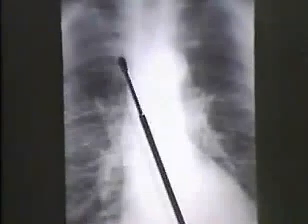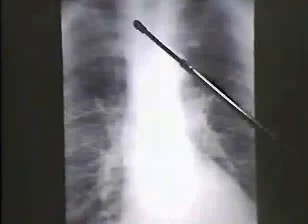This is the chest film of this individual, and as you can see, we were looking at a CT scan that was perhaps at about this level. And you can see on this film the shadow of the aorta that gave rise to that transverse appearance. You can also perceive the margin of the mediastinum as we normally see it on most chest films, being the superior vena cava. And if you look closely along the right side of the tracheal air column, you can see the tracheal wall shadow, which is caused by that thin band of tissue I pointed out on the CT scan.